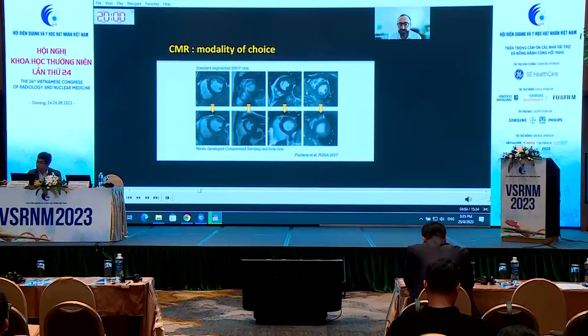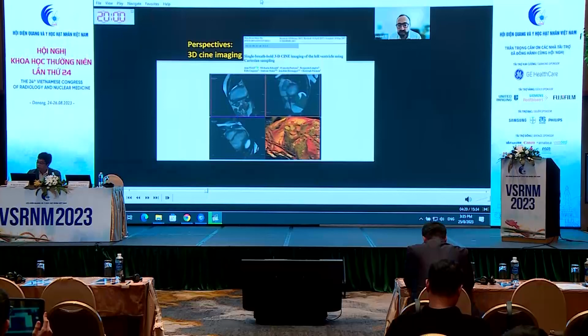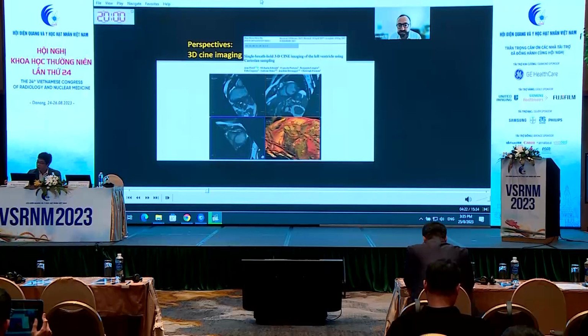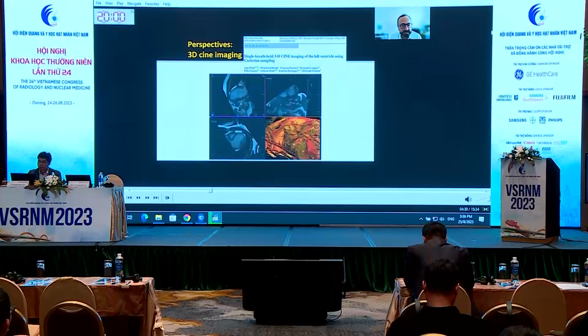And thanks to the different technical progress, CMR is now feasible in most patients, including patients with arrhythmia, shortness of breath, and children. And similarly to CT, we now have 3D sequences to explore the entire cardiac volume, and I hope you can appreciate that this is quite cool, isn't it?